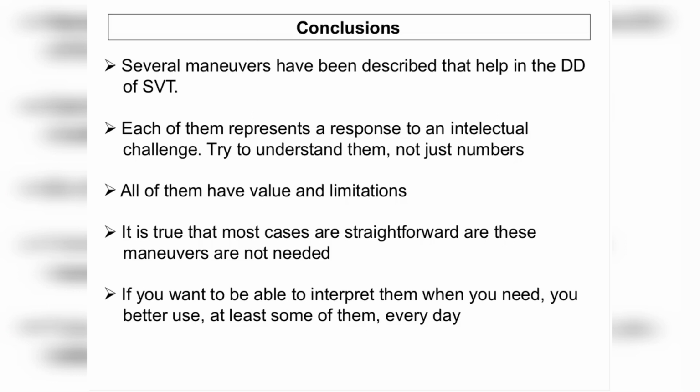Thank you very much, Jesus. Thank you, Fernando. Fusion actually means the activation of a chamber by two different activation wavefronts. It is crucial that this has to happen at the same time. So time is crucial: activation of a chamber from two separate activation wavefronts that occur at the same time.